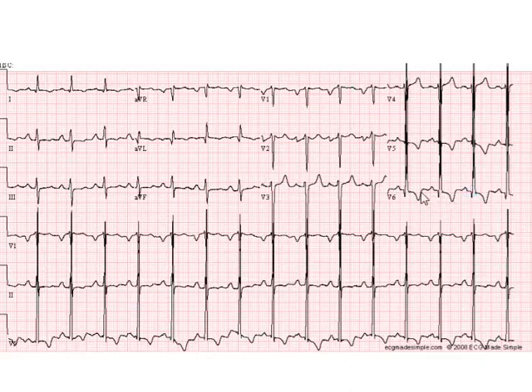Here, there is no evidence of any abnormal Q waves, suggesting no evidence of infarction. There are negative T waves in lead 1, AVL, V5, and V6, although the STT pattern is not typical for the strain pattern related to left ventricular hypertrophy.